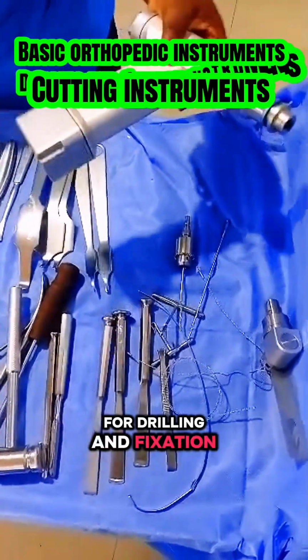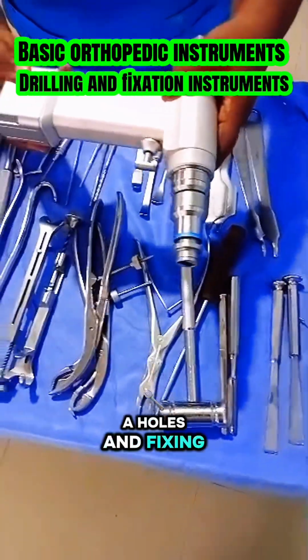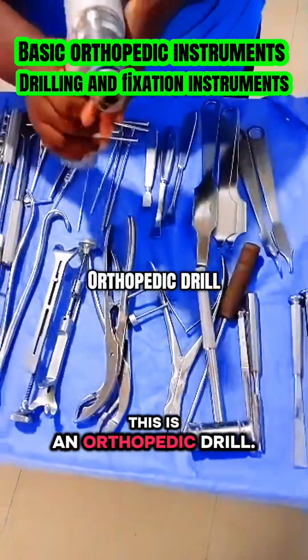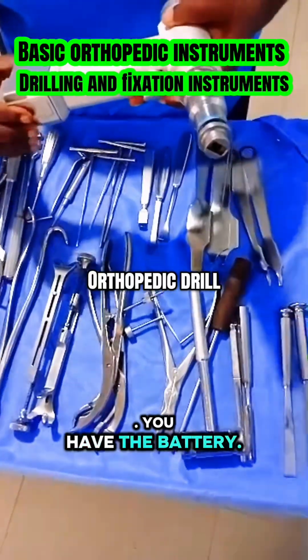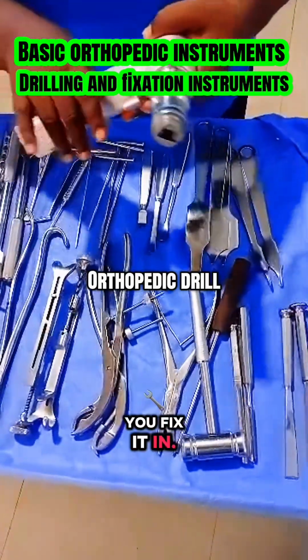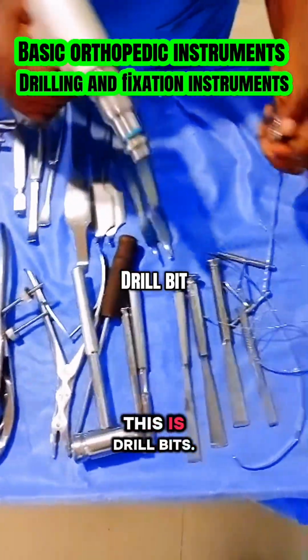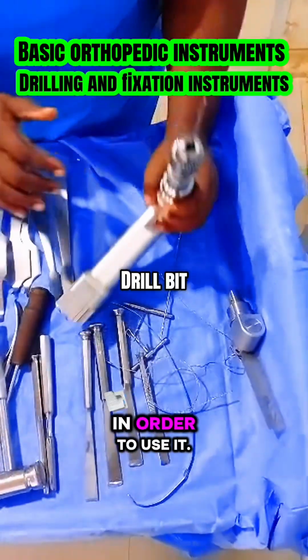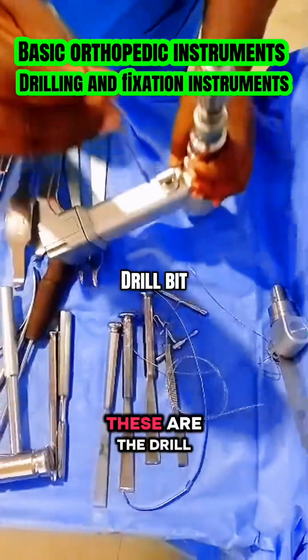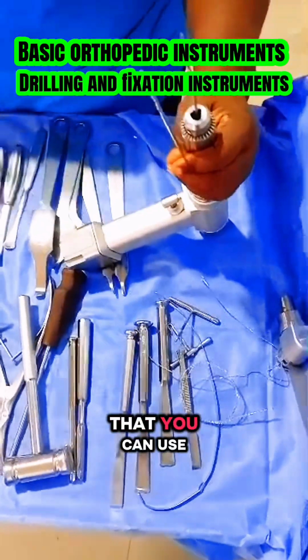For drilling and fixation instruments, they are used to create holes and fix implants. This is an orthopedic drill. This is a powered one. You have the battery. When you charge the battery, you fix it in. For you to use this, you have to use drill bits. This is the drill bits. So you fix it in order to use it. These are the drill bits. They have various sizes too that you can use.